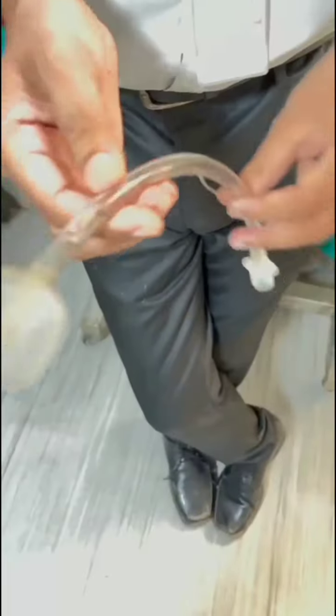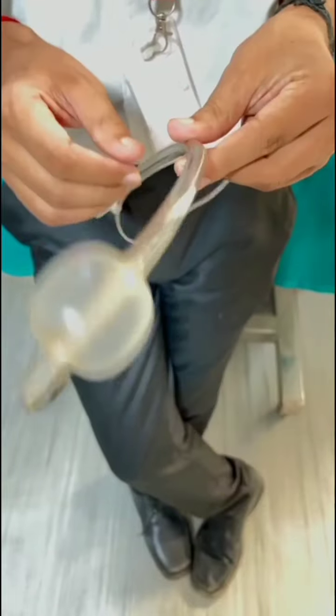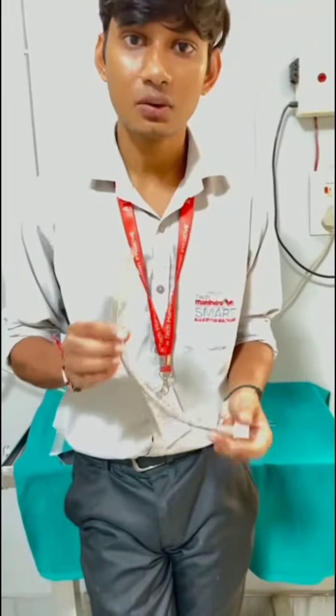Now we will talk about the complications of the ET tube. During insertion: trauma to teeth, lips, tongue or vocal cord, esophageal intubation, wrong placement, hypoxia, laryngospasm, bronchospasm, pressure necrosis of the trachea.